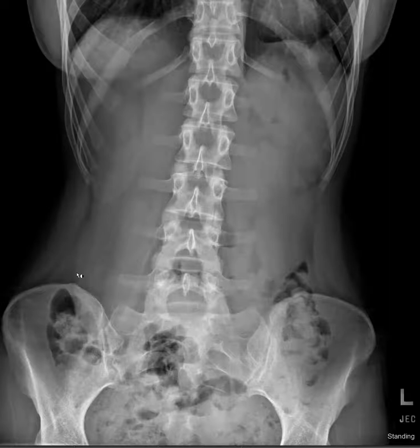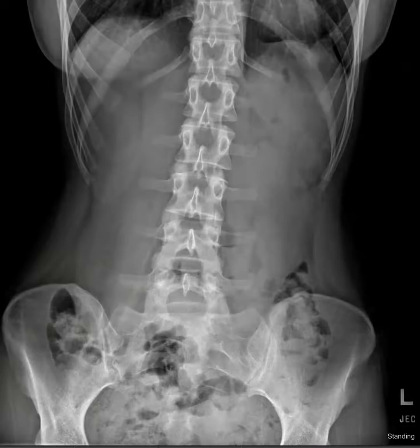Normally the kidneys drop a certain amount when we stand, but if it drops by more than two vertebral bodies' width, I think then it becomes a wandering kidney. And she can palpate it when she presses into it. Her pain was very positional, and she's skinny enough to be able to palpate this. Wow. Cool. Okay. I think that's correct.